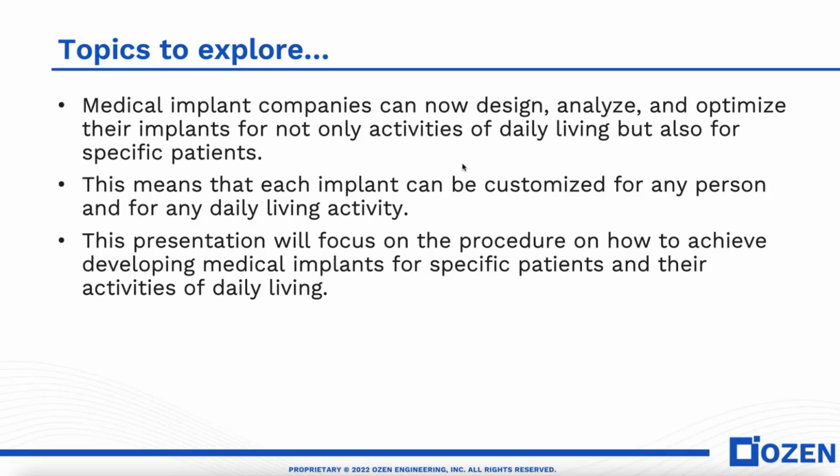So this means that each implant can be customized for any person and for any activities of daily living. So in this presentation, we are going to talk about the procedure on how to achieve developing these medical implants for specific patients as well as for specific activities of daily living.